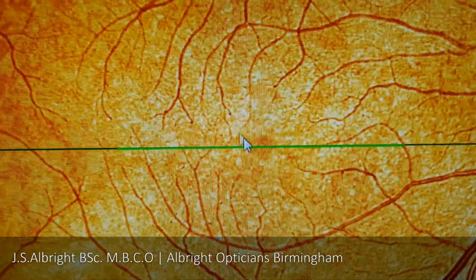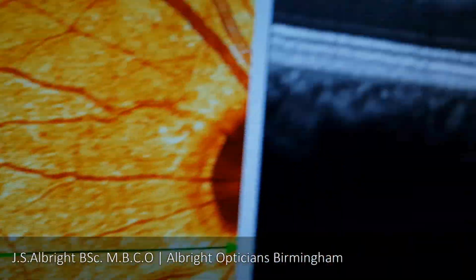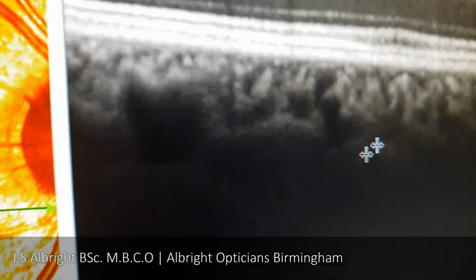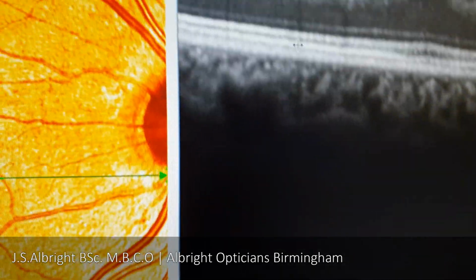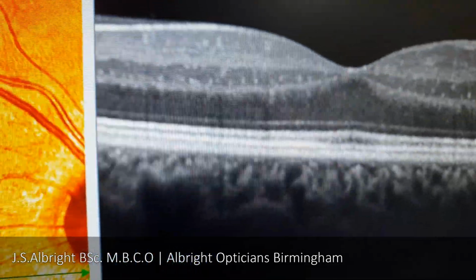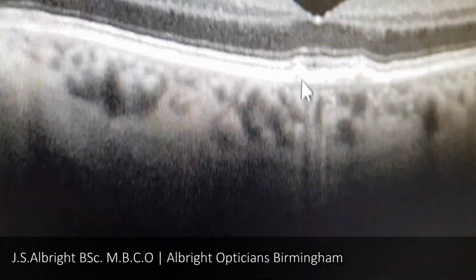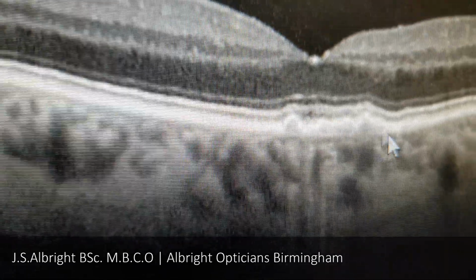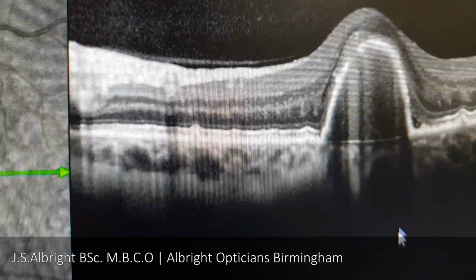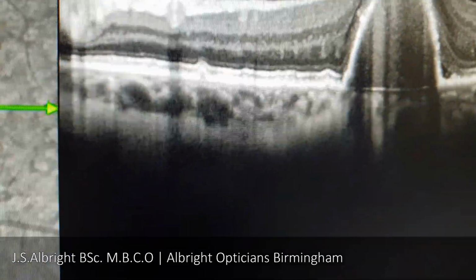It's an avascular zone, so most of the nutrients that area gets come from underneath the retina. And it's underneath the retina that you tend to get macular degeneration developing. This one, we're looking for a smooth membrane at the back. Now, I can show you an example of one where it's changing with time. Here we have drusen forming, which you can see those little lumps at the back there. I have one of a wet macula. This one is an obvious wet macula because you can see that huge swelling at the bottom there.